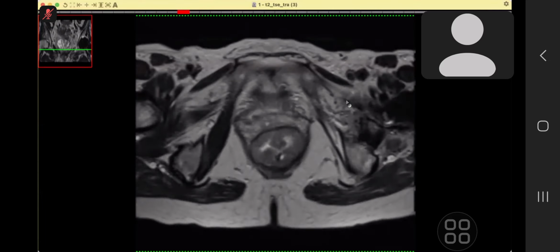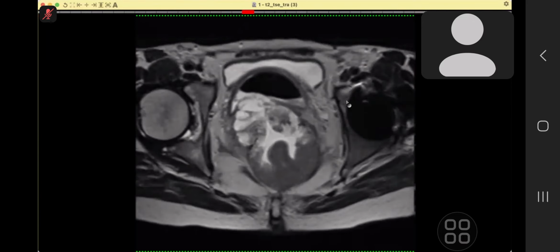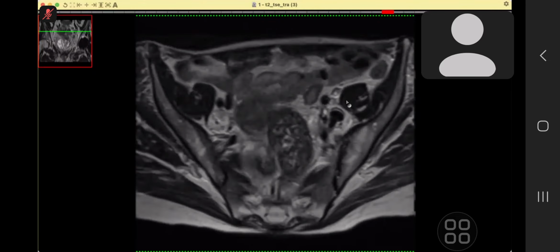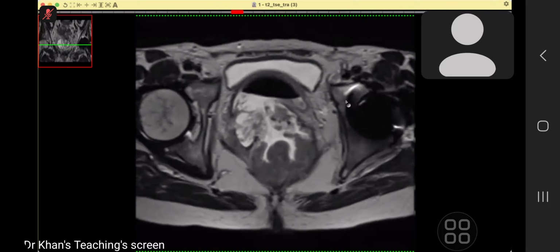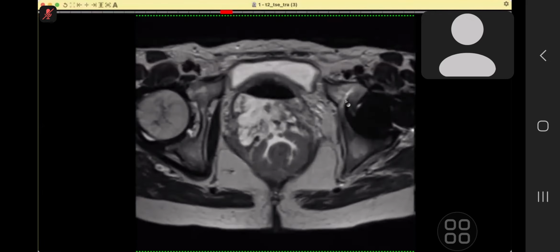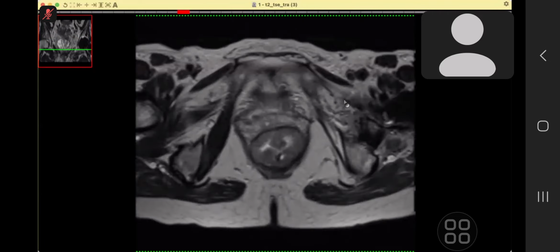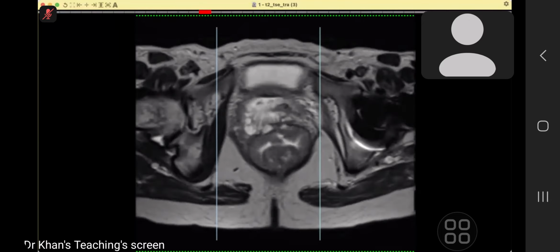There is a complex rectal mass that is almost circumferential, however asymmetric, and I think it is invading anteriorly through the anterior wall of the lower anal canal and reaching the vagina. The urinary bladder is pushed anteriorly by mass effect.